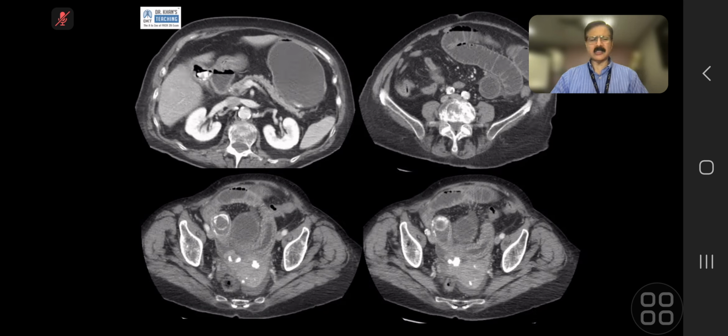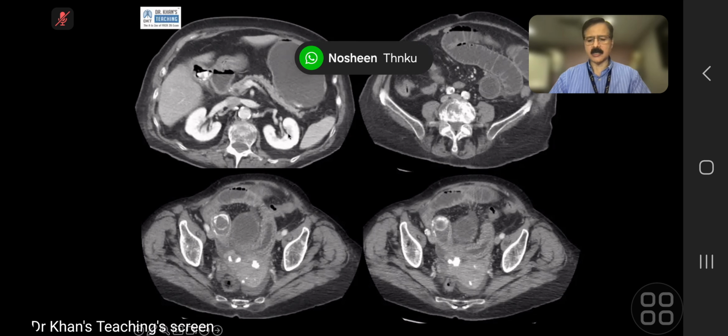If I'm not wrong, I think this time you got it in the exam. Yeah, erosion into the colon and causing large bowel obstruction. Usually, it is secondary to when in the large bowel there is a diverticular stricture, etc. Having said that, this is another case in which you can actually see another stone here and the fistulous communication here.